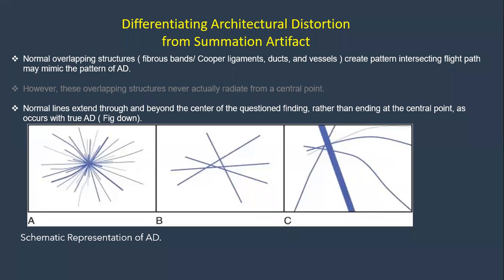No, this area is likely representing architectural distortion. How could we be more confident to tell this is architectural distortion? Yes, sometimes there are challenging cases. It's difficult to say exactly what is this and what is that. But most of the time we have to tell.